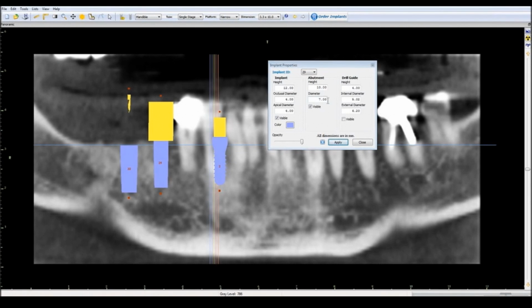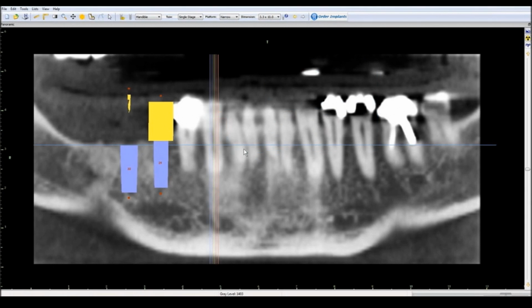You just dial the number in here, and you can make it anything you want. So now, by virtue of this abutment contacting the distal of the first bicuspid, and the fact that the implant is centered in the abutment, the spacing, angulation, and relationship between this implant and the first bicuspid is right on the money. The next thing I like to do is duplicate this implant.